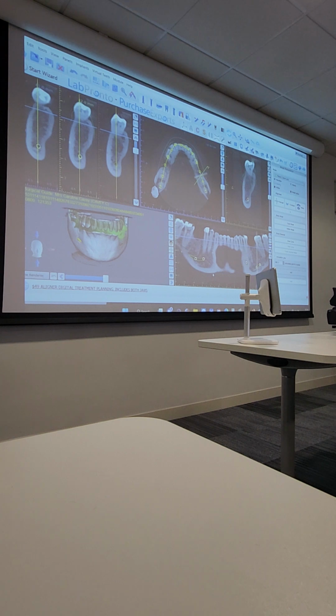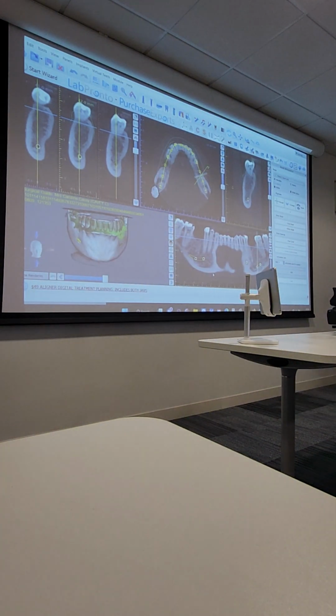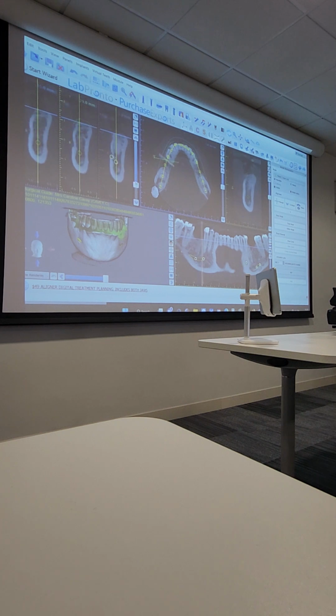And it's going to ask you which arch it is, and it's just going to line them up. Yeah? That's alright. So, happy with the alignment? So I normally, like I said, scroll through here very quickly, okay? I'm moving across the panoramic curve here, and I do a spot check. I just do this, following the arch.